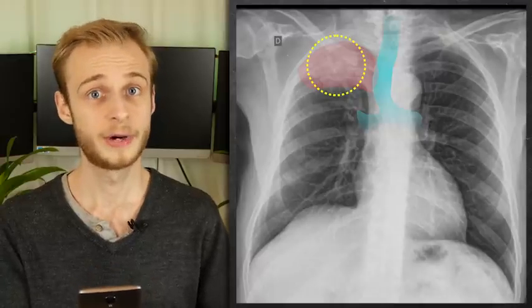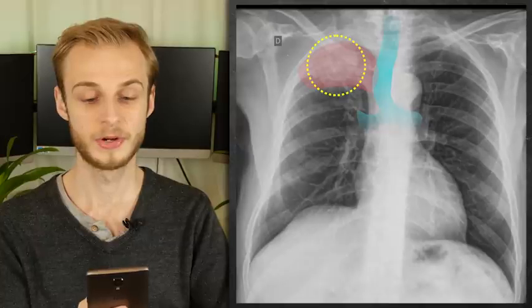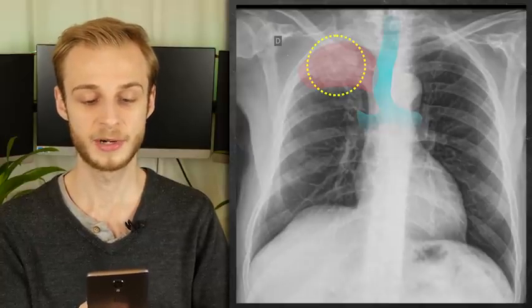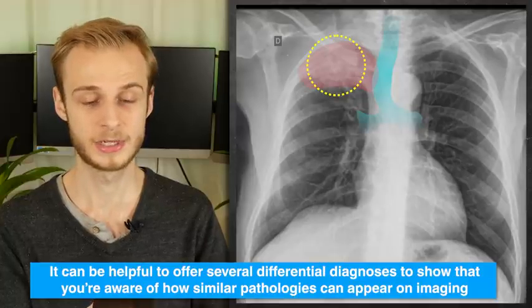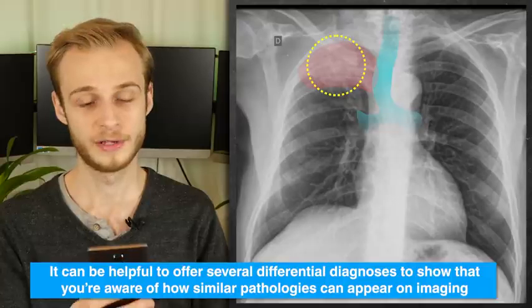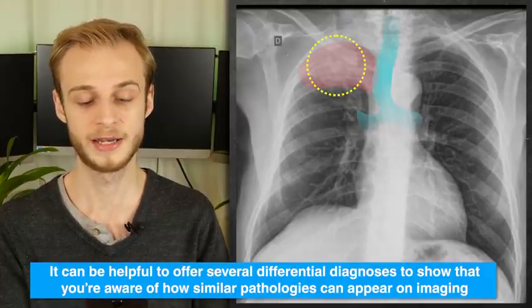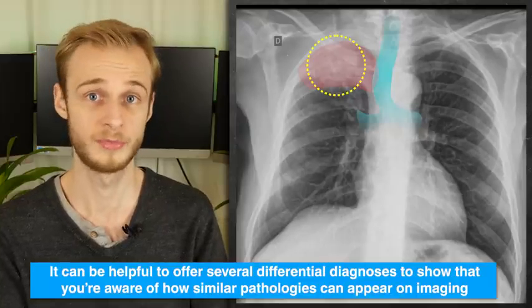So just to show how you might combine this with a clinical vignette, based on this patient's 40-pack year smoking history and his exam findings of partial ptosis and constricted pupils, I would suggest a tentative diagnosis of a Pancoast tumour, which is an apical lung tumour, with some involvement of the sympathetic chain. Other differentials might be a pulmonary met from elsewhere, mesothelioma, or something like primary tuberculosis.